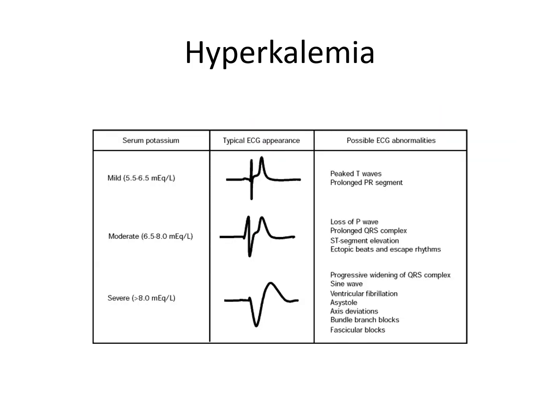So this is the classical progression of hyperkalemia. Think about two strings. One that is pulling upwards and it's making the T waves taller, and the second one that's pulling horizontally and kind of unspooling the whole QRS-ST segment on the horizontal axis, making it lose the P waves first, then widening the QRS segment, and then finally causing a sine wave and then asystole.